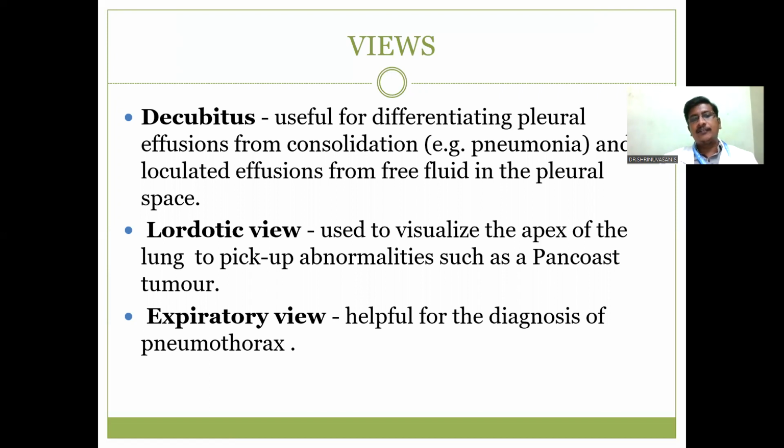So we can differentiate effusion from consolidation also, because in the PA view both consolidation and effusion will appear white, only opaque. So to differentiate effusion from consolidation, when you are doing the decubitus view, the consolidation will be present in the same position, but in case of effusion, it will go to the dependent area and form a layer laterally. Sometimes loculated effusions you can see in the same place.